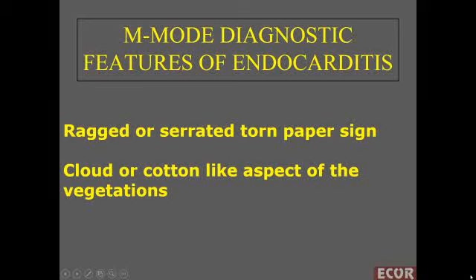I'm going to add an issue not usually reported in lectures about infectious endocarditis: the utility of M-mode for the diagnosis of vegetations. We had talked about the usual features of a vegetation: the site of the vegetation, the associated regurgitation, the chaotic movement, no restriction of valve movement, and the always necessary clinical suspicion for this diagnosis.